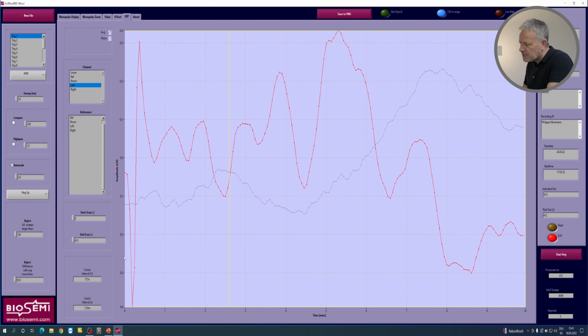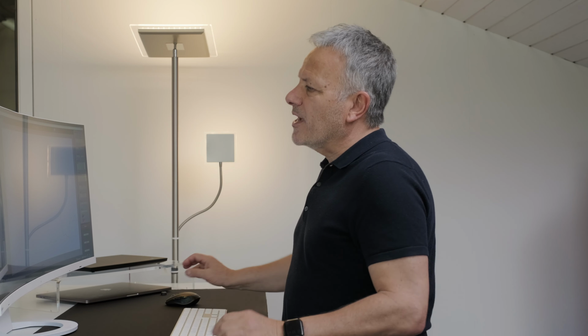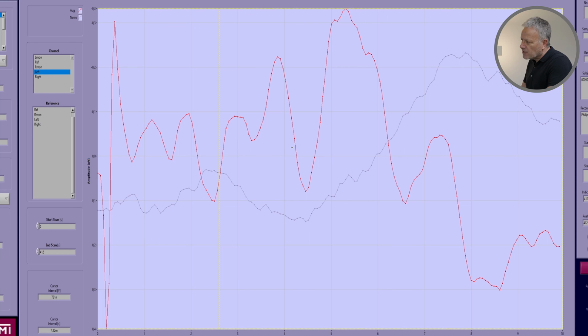It actually is positive as it's going down. We're showing negative up. Remember, the ABR is positive, but due to the actual connections in the amplifier, in the ADC box of BioSemi, it's actually the other way around. Okay, so here is the stimulus artifact.